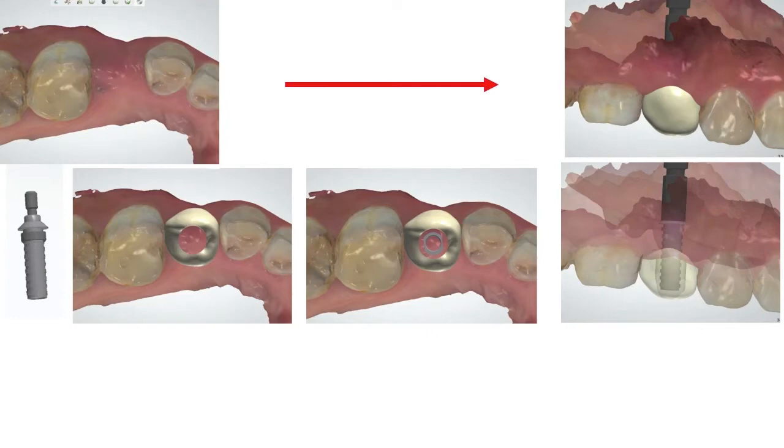So it's built into the libraries by design. Because again, what we've done at Paltop is design this for easy usage by the dentist. Built into the library of the provisional component, because it's understood the provisional component needs some leeway, is a spacer. So if you look at the component inside the provisional, I'm going to point it out to you.